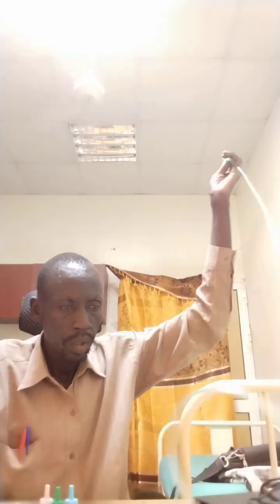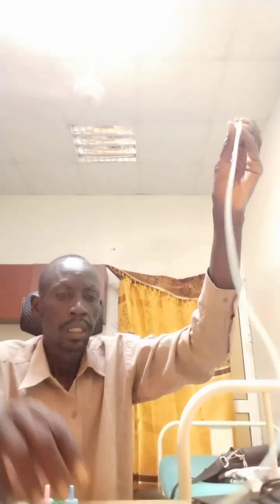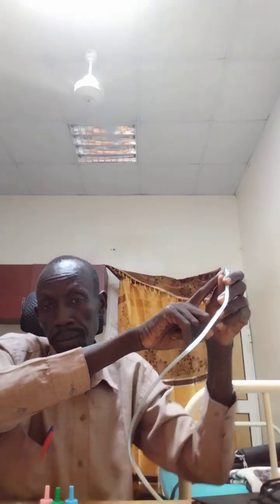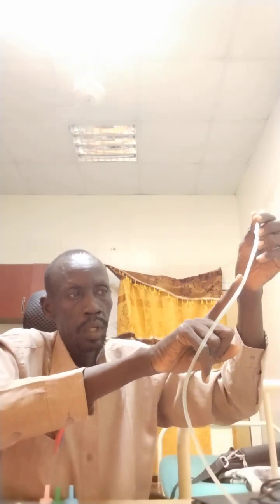So, what does Bernoulli say? It says, supposing you connect it to the oxygen cylinder or anesthesia machine, and then you open the flow meters, 10 liters per minute. So oxygen that is coming from the anesthesia machine is a pure one. It will run fast.